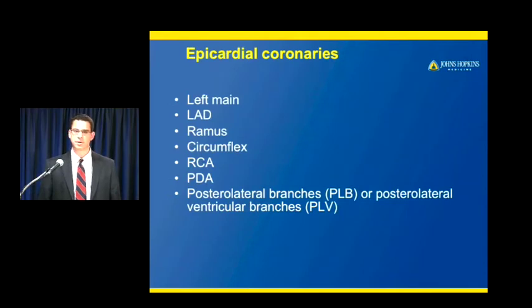So first, the epicardial coronary arteries. This is a sort of a comprehensive list of all the epicardial coronary arteries that we concern ourselves with in cardiac CT and cardiac catheterization. We're going to review each one individually and talk about their anatomy, their branches, and what vascular territory they supply.